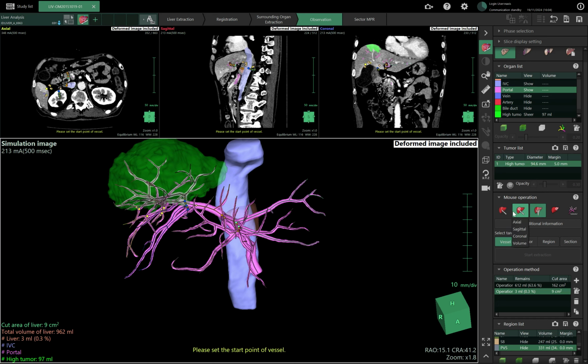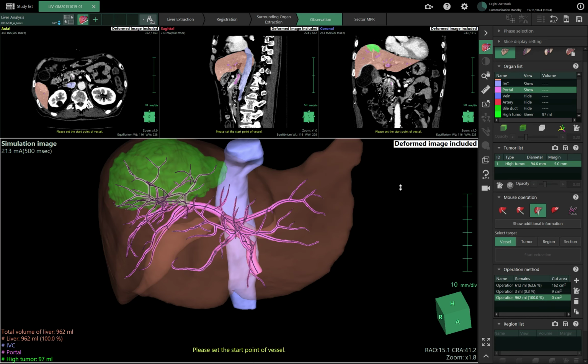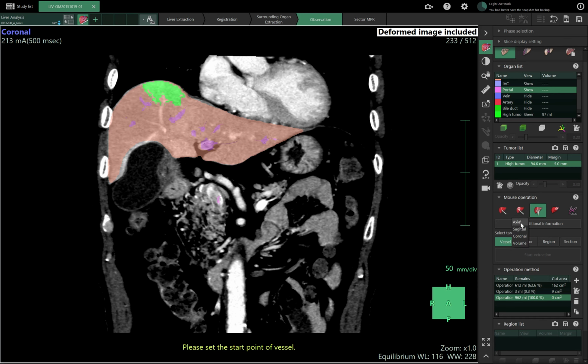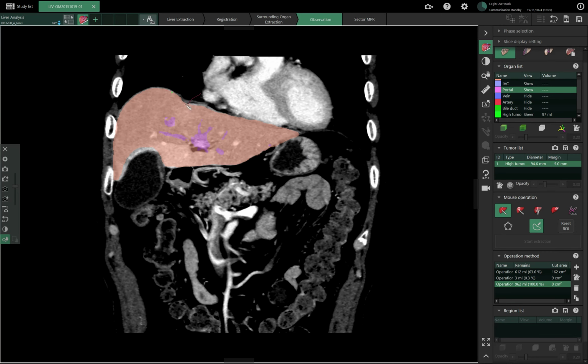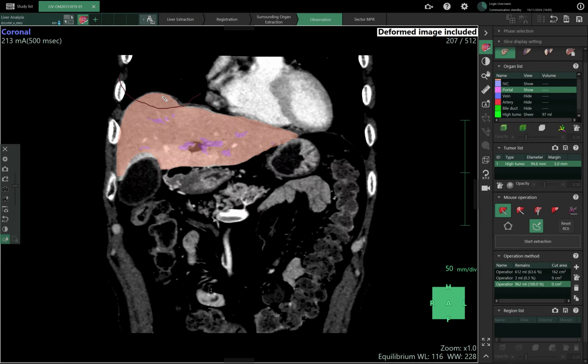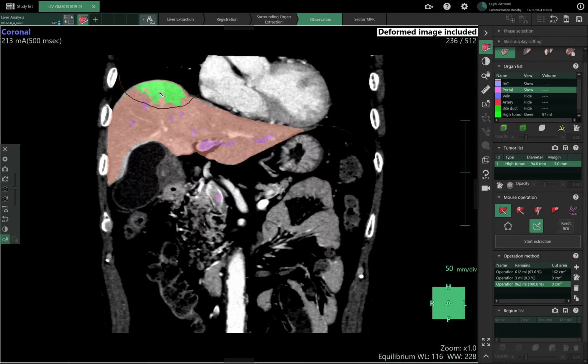And finally, we have these other tools to also create regions by segmenting manually. This will be a completely manual segmentation. For this case, for example, we can create a segmentation 3, and let's say that in coronal I can create an ROI or just plain. More or less, the functionality is the same. And here I will have the possibility to resect manually and set some regions. This is more or less okay.